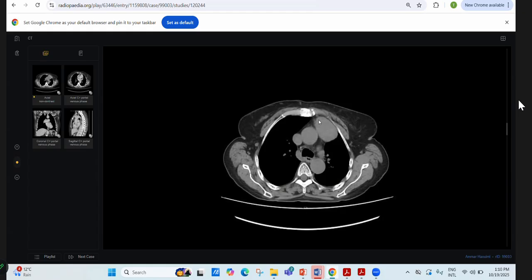Always describe it well defined, this density mass. Okay, then you did really well. You mentioned there's no calcification, no this, and you ruled out germ cell tumor many times when you were explaining. But when I asked you differentials, you're not saying it. You are just picking two differentials, thymoma and lymphoma. And then I particularly asked what else, and then you said germ cell.